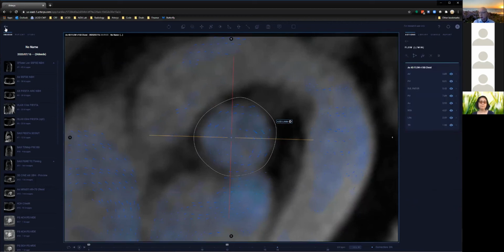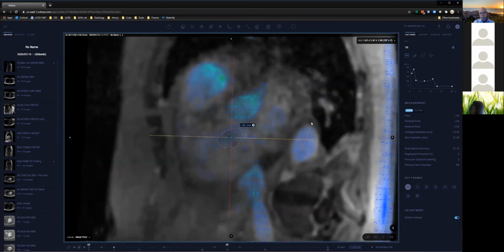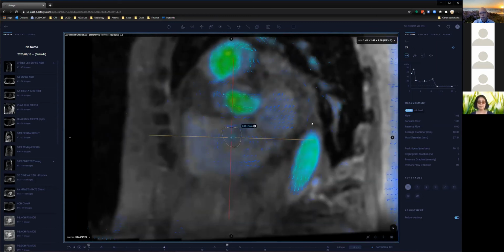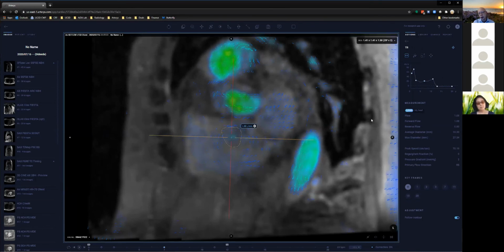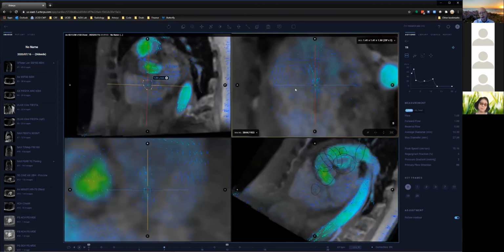Albert, can you just quickly, going back to the tricuspid regurg segmentation that you did, can you just hit on the interpretation of the data here in our software? Because this jet is entirely regurg, but the numbers show up as forward flow. Oh yeah, I mean, yes. I think you just have to know what you're measuring. In this case, what I'm measuring is the jet itself.